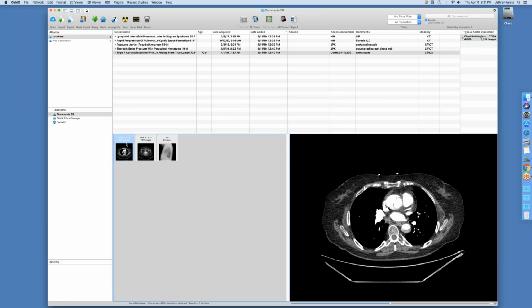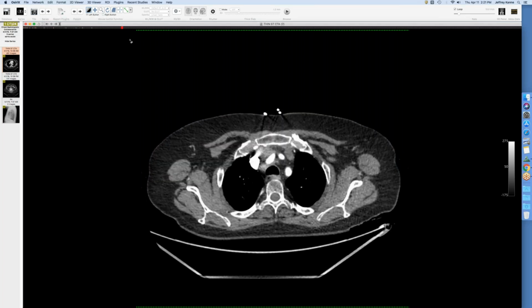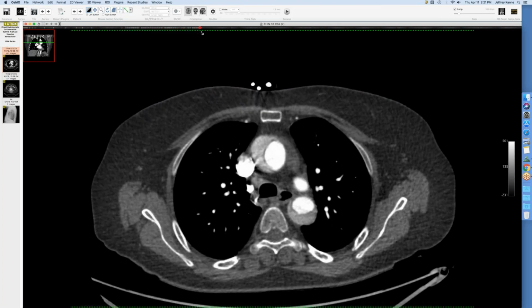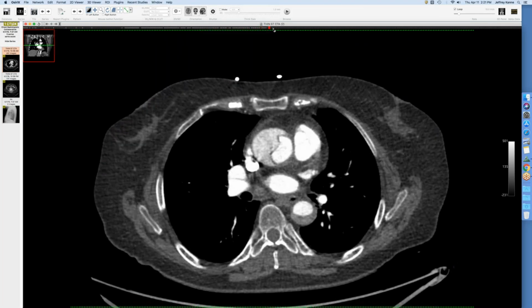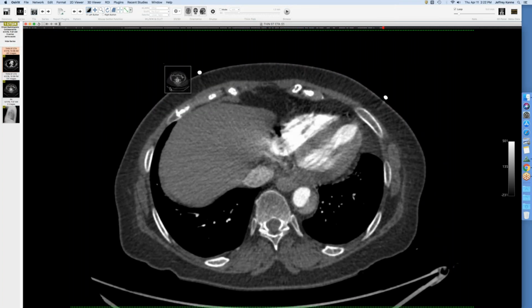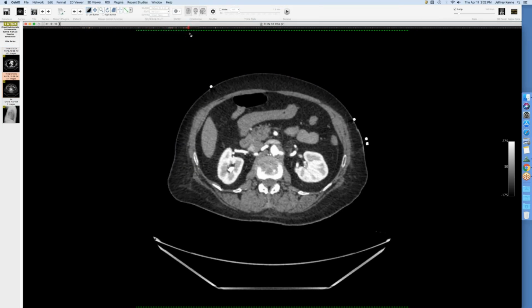This is a case I'm curious if you have any insight on. This was a PE study, and it goes with your case, Howard, in that it's a nice example of a type A dissection, except this one is a true dissection, and so it was suspected pulmonary embolism. We do see these every so often, and the real reason I'm showing it is that they followed it up with an abdominal CT just to get the full extent. I'm curious what you think about this.